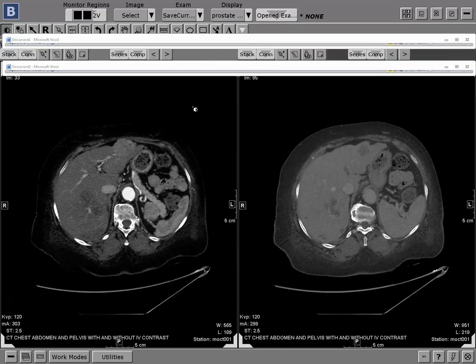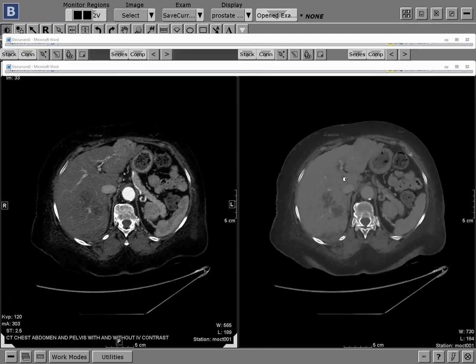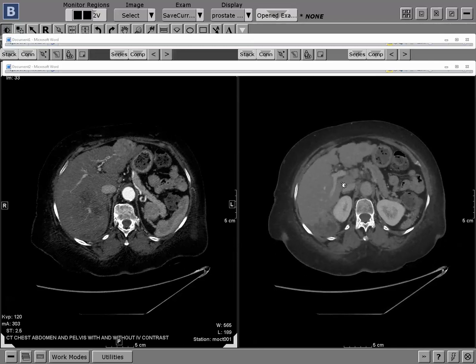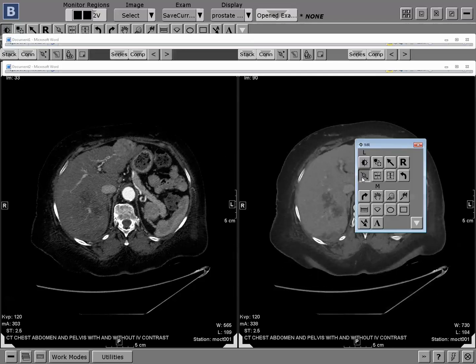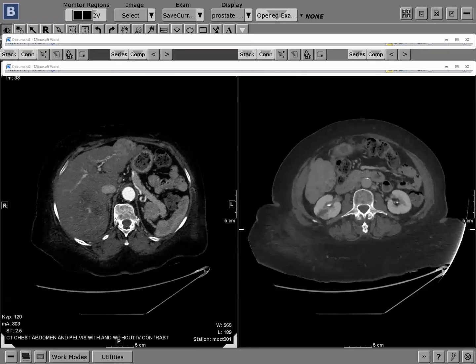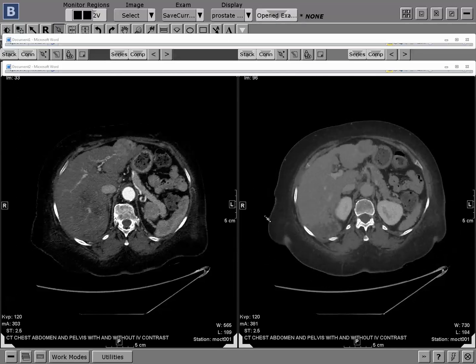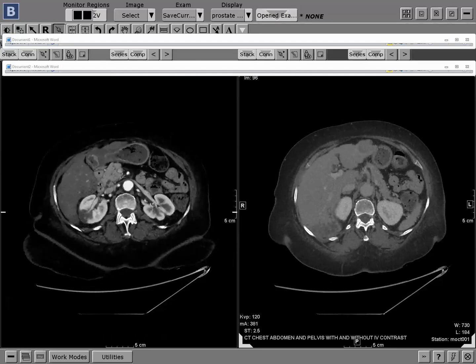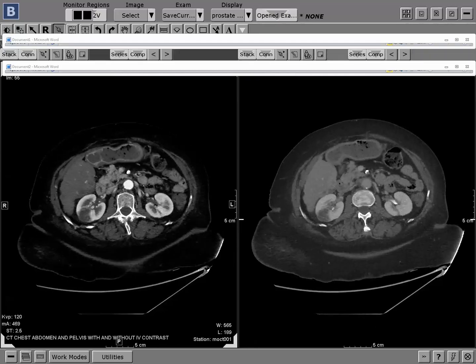Is it a microvascular thrombosis or a gross thrombus like we see in the PE, for example? Well, we didn't see any thrombus. Everything was patent. But again, liver infarct is so uncommon. I would assume that this is something on a micro level, because again, the same thing is happening to the kidney.